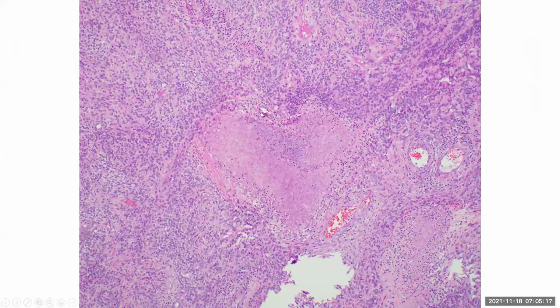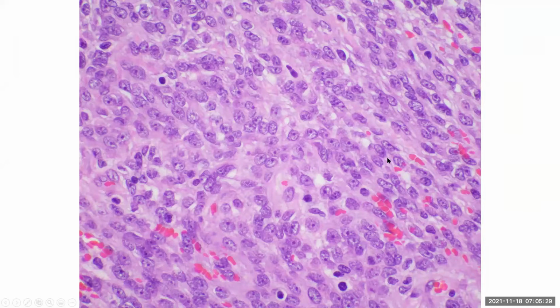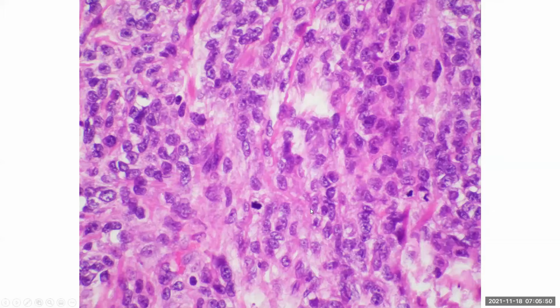Okay, so this is the tumor. This is what we call pseudopalisading necrosis. The tumor is very cellular, as you can see here, and there are multiple areas of necrosis. In terms of cytologic features, there is significant atypia and pleomorphism. And what does this mean? It means that there is significant variability in size and shape of the cells. And there is another atypical feature, which is the presence of these prominent nucleoli. More importantly, the tumor is mitotically very active. In this high power field alone, I can see 2 mitotic figures. The total number was 22 per 10 high power fields.